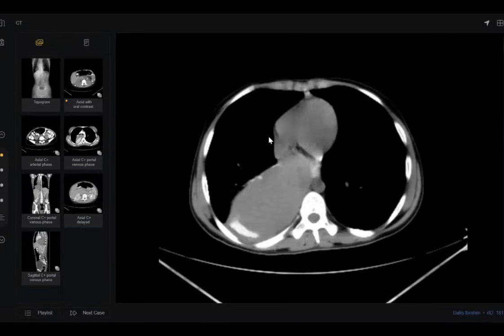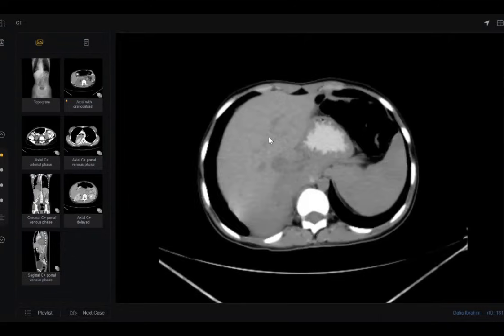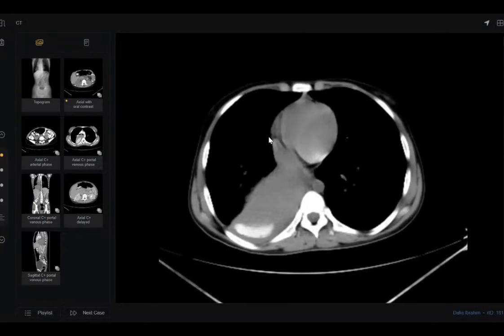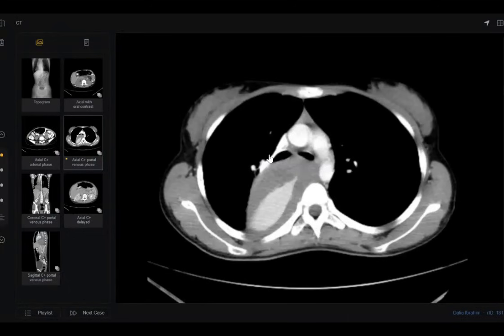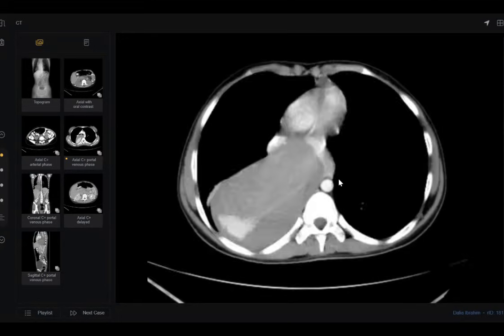Okay, so here I'm provided with the contrast. These are the non-contrast axial CT thorax and abdomen images. I can see that some oral contrast has been given to the patient, and there is a soft tissue density mass lesion. I think these are the herniated bowel loops. I want to see the continuity with the bowel loops, if I can see the lower cuts.